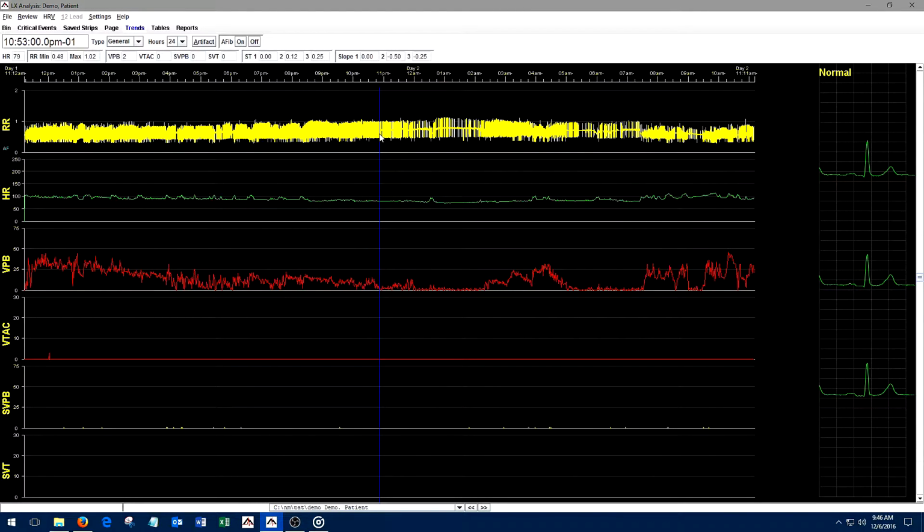The Oximetry Trend, Enhanced, Enhanced Plus, and Pro levels. For oximetry patients only, this additional trend screen contains oximetry data, including 1. A color-coded trend line, colored the same as the beat labels, of SpO2 data on a scale from 60 to 100% saturation, and 2. A white trend showing pulse oximetry data. For users with LX Sleep, this trend screen also shows the apnea trend and the AHI probability chart, which are explained in more detail in Appendix D, LX Sleep Apnea.